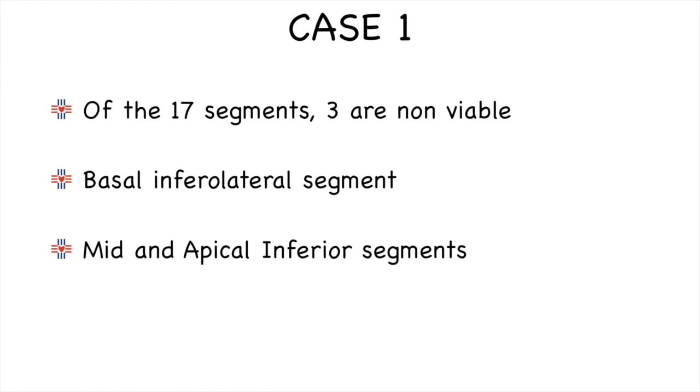So what is very apparent in this case is the LCX territory, because this is a left dominant system, there were 3 non-viable segments. However, the LAD segments are viable, and if revascularization is considered, it should be done in LAD segments. Sometimes we get asked to quantify the scar burden.